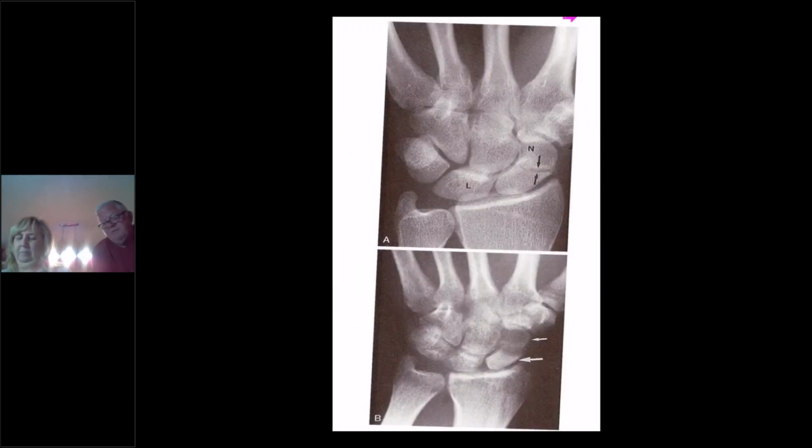So here's a picture of that scaphoid I was talking about a few minutes ago, our navicular view, and the arrows are demonstrating a fracture, a midline fracture of the scaphoid. And here's a good example of what it looks like when it's not treated appropriately. And now you got a big problem because now you got a big hunk of dead bone, and it doesn't matter how long you put them in a cast, that joint is going to be trashed.